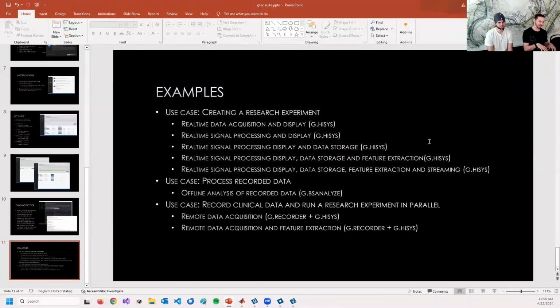So you need the PC as a data acquisition system. Then you could stream data in real time to the Meta Quest if it's in the same network. And if you're running a paradigm in the Meta Quest, you could align the trigger in there, and then you would have a BCI system.